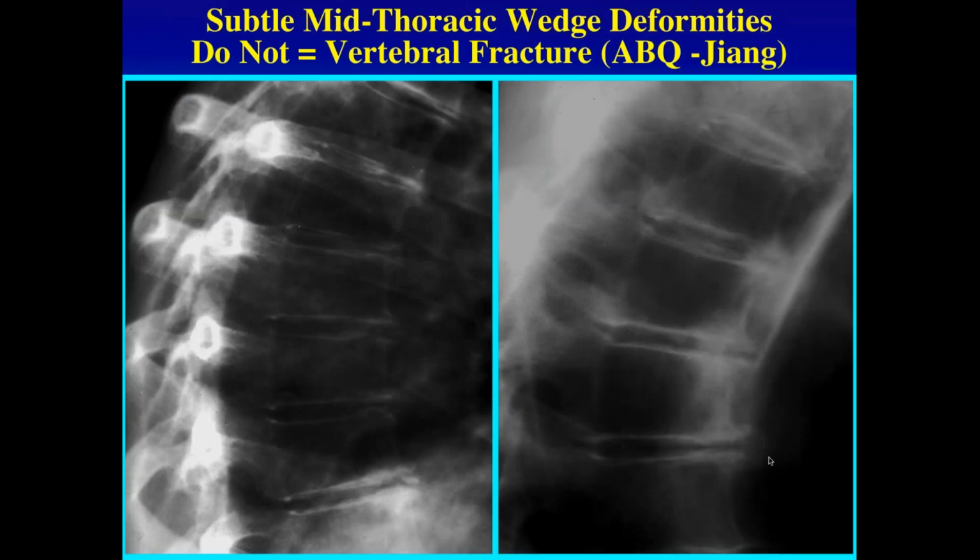Now, subtle mid-thoracic wedge deformities do not equal a vertebral fracture. And this, of course, has been emphasized in our early descriptions of the Genant semi-quantitative evaluation, and has been further emphasized by Dr. Jiang with the so-called ABQ approach, which is algorithm-based qualitative assessment.